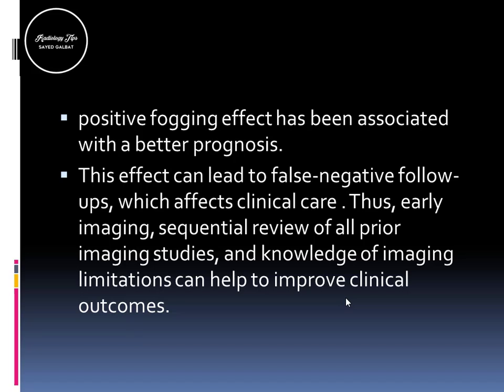Okay, and what's the solution if you face something like this? You have to inject contrast, because the fogging effect occurred just a few days or few weeks after the presentation of the patient. So you will see the infarction area as a normal area, and this is the subacute stage. And before this case, I showed you that in subacute stage, the infarction will show gyral pattern of enhancement. So your solution at this stage, you will just inject the contrast and have a delayed phase this time to see the classic appearance of gyral pattern of enhancement.